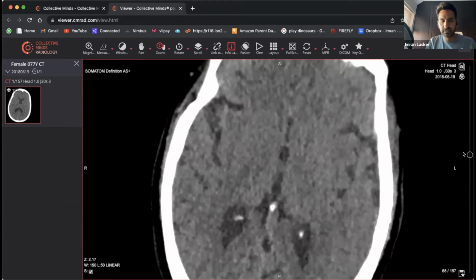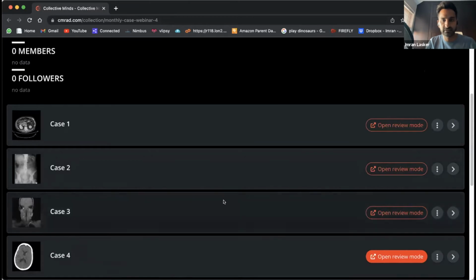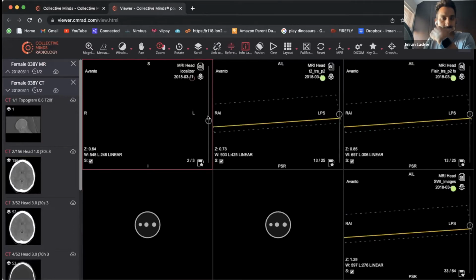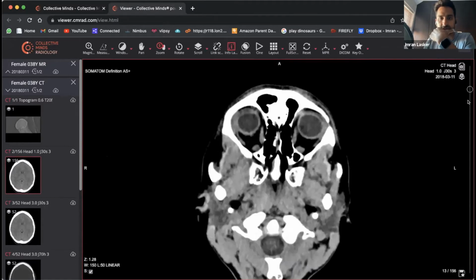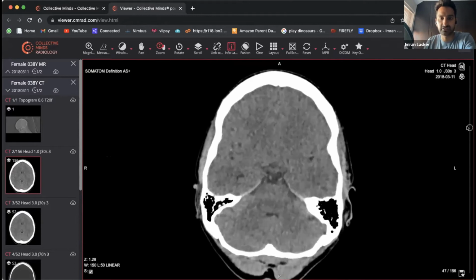And if I remember correctly, I might have uploaded the CT scan for those of you that don't believe. Let's see, I think this could be the CT scan, so let's have a look. So case number 2. Maybe just another example. Hang on, let's open this one. Let's have a look. Let's go through. So scroll through. So look, actually, this is another example of the same thing.